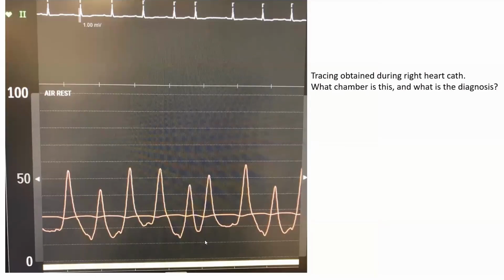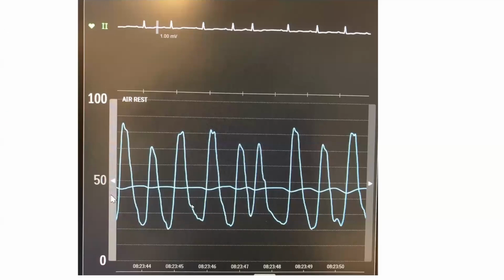And I want you to compare in this patient the morphology of the wedge pressure with V wave. Look at it, how it's peaky, how the slopes up and down are nearly equal, and you're horizontal or upsloping diastole versus this. This is the PA pressure in that same patient. Look at it, sharp upslope, slow downslope, and it's downsloping diastole. You really don't get any horizontal segment. It's all downsloping diastole.